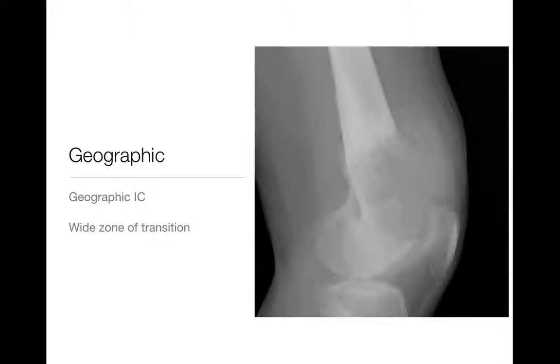And these are scary looking things, and because they're scary looking things, we're going to think of much more aggressive and malignant processes. Could there still be a benign process that could look like this? Sure, it's possible. For example, giant cell tumors. Giant cell tumors can be very locally aggressive at times, so you can have aggressive giant cell tumors. Infection is going to be on this list as well too. Infection can look quite nasty.